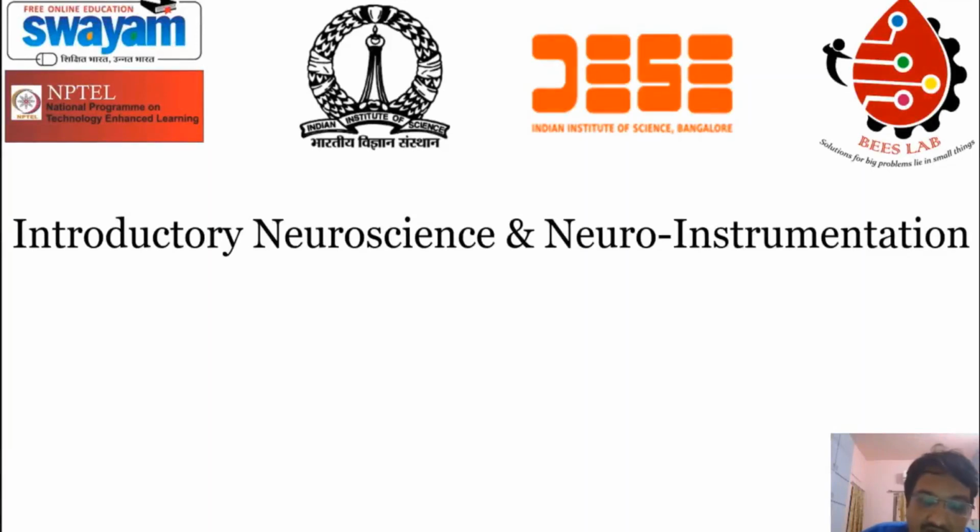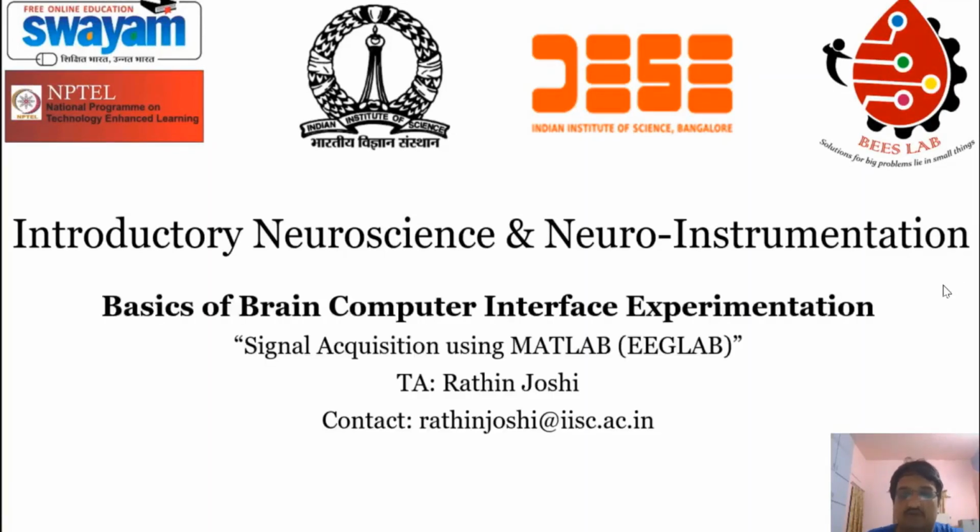Hello everyone. Welcome to the final submodule of a brainwave acquisition and recording system demonstration. So in this module, mainly we will talk about how MATLAB can be useful for EEG signal analysis or EEG signal processing. Initially, I'll give you an introduction about a toolbox named EEGLAB, how it is being useful, and what are the functions which you can do for different recorded EEG files.